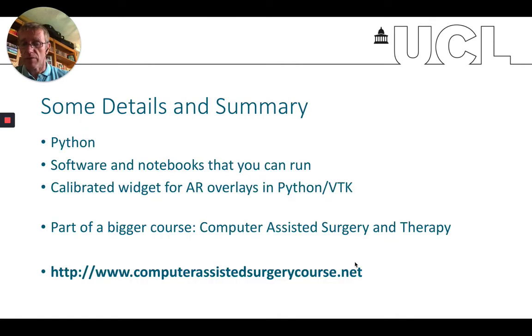So in short summary, it's all in Python. We've provided software and Jupyter notebooks that you can run. The most fiddly bit is probably the AR overlay, but we've provided a widget for you, again in Python and using VTK. And it just remains for me to say that this is part of a much bigger course that we've developed at UCL called Computer Assisted Surgery and Therapy.